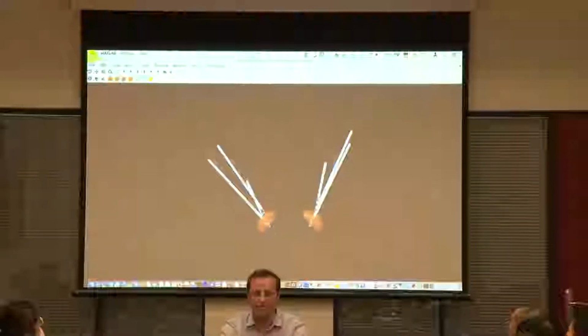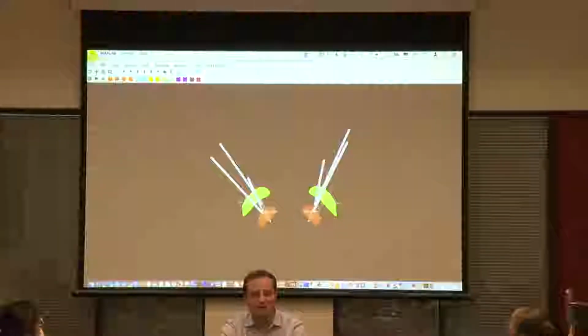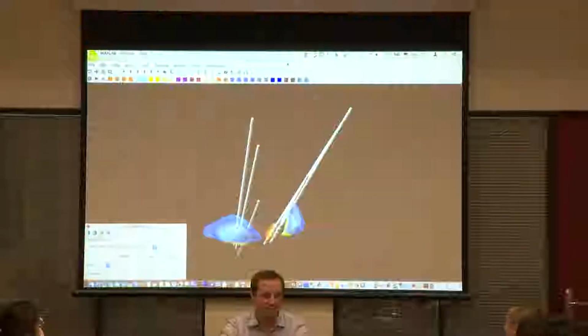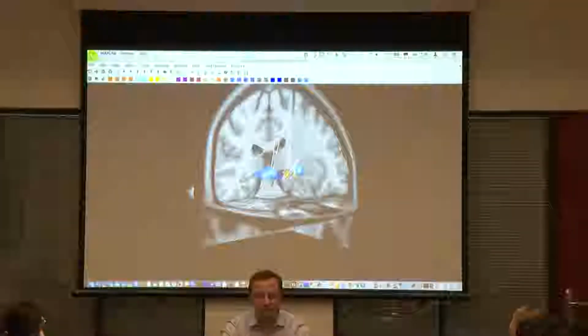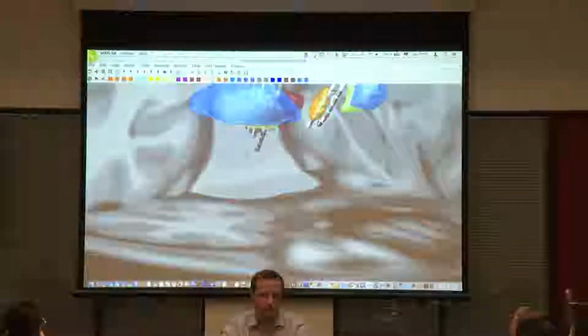So that's maybe a first function. Actually 2 of them are not well placed, so it's not a good example, and it's really true, unfortunately, so it's not just a bug. Okay, and then we can zoom in and everything, and that's great. So far, so good.